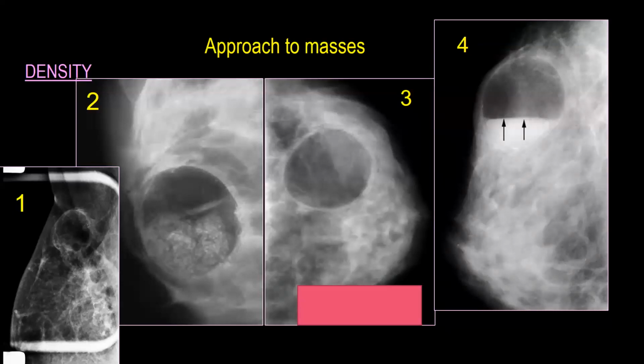There is one more characteristic of all these cysts. Unless it is acute infection or acute fat necrosis, it doesn't give a fluid level. This is the old picture, and it does not give the appearance of acute inflammation and these things. Okay, so these are 4 different cases.